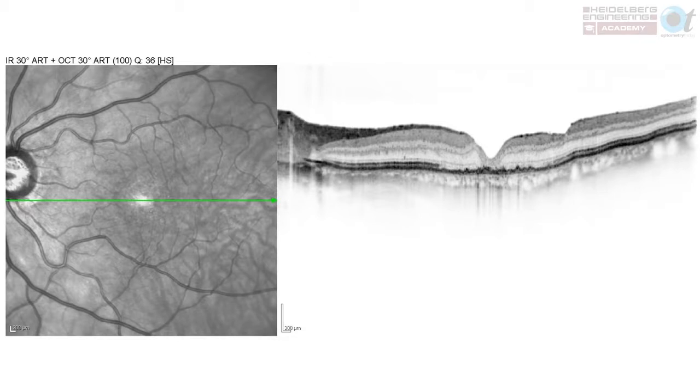Those of you who said it was the same or worse are actually correct. But how can that be? Again, if you look at the OCT, you've got good anatomical closure of that hole, yet that patient has not gained any functional vision. And it's the OCT that gives you the answer. Because again, if you look, the inner segment outer segment junction is missing centrally on that OCT image, with downward collapse of the outer nuclear layer with foveal atrophy. So the OCT appearance allowed us to explain the paradox of technically successful surgery, yet worse vision. So again, patients with macular hole, who should you refer? All cases of patients with OCT confirmed macular hole should be referred to the hospital eye service for further management.